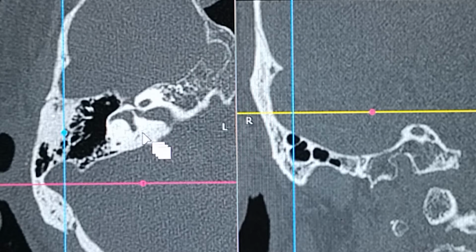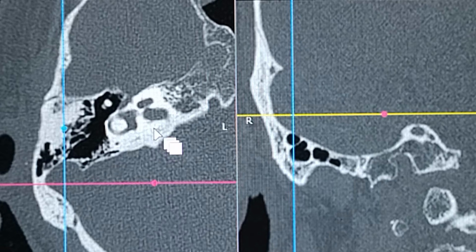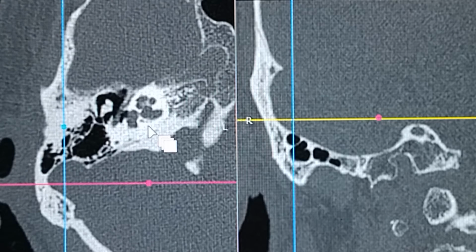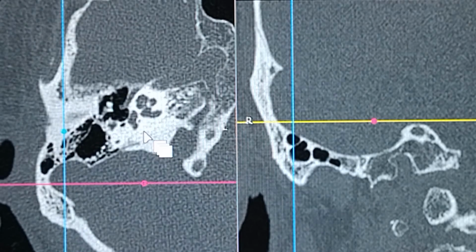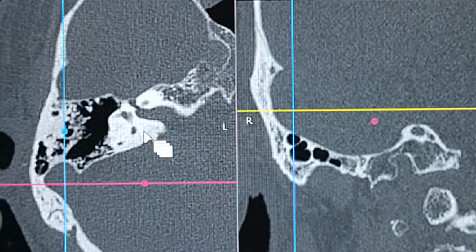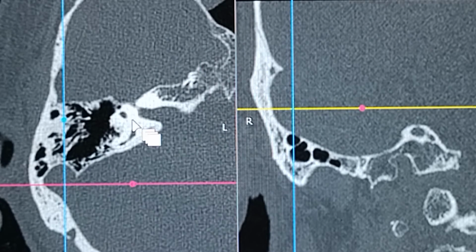Very difficult to visualize the singular nerve canal, which is in the posterior. So this is the posterior canal right there. We got to see posterior inferior, right? So this is the cochlea, this is the IAC. This is the posterior, this is the inferior vestibular nerve. Somewhere here should be a singular nerve branch, but not very visible here, I guess. Not very visible. Okay, so that was basically the IAC, the contents of the IAC, a rough estimate of the facial nerve, but I'll show you in much detail later on again.